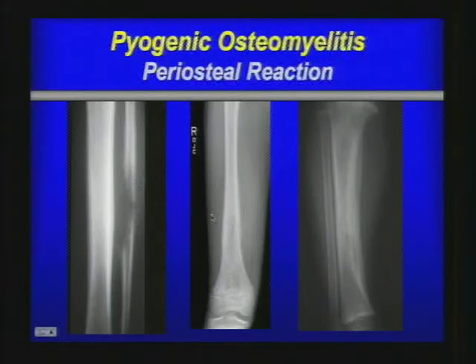This we've looked at before. This is more a subacute type of periostitis, osteomyelitis. And finally, on the right side, you have a patient that has a chronic type of osteomyelitis where you see solid periosteal bone formation, pretty substantial sclerosis, very well-defined borders, and this clearly is chronic.